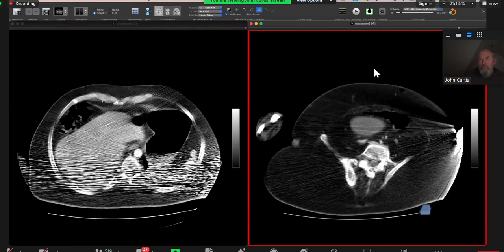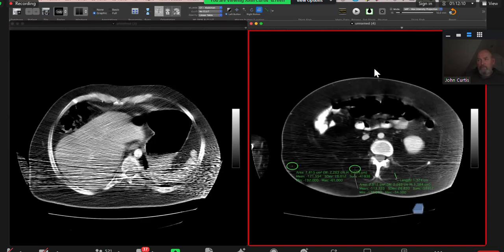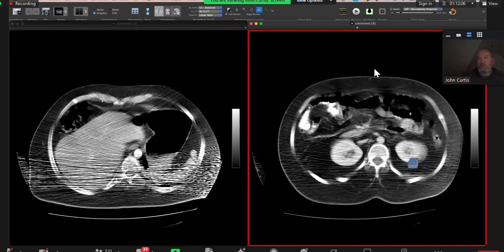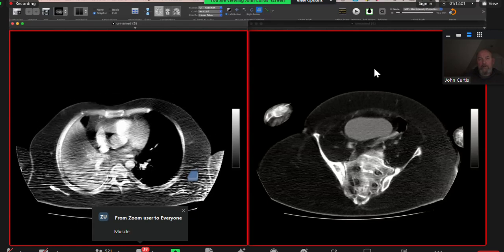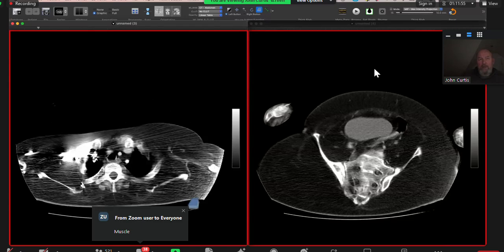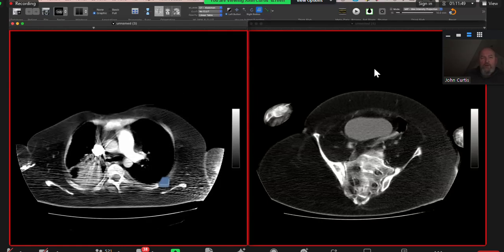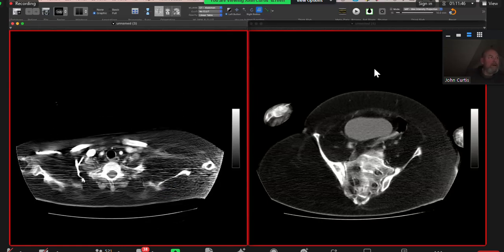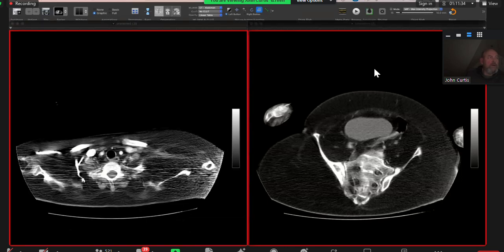Where are the gluteal muscles? They're absolutely absent. This is replaced with fat. Where are the pectoral muscles? They're also absent. Where are the scapular muscles? So all the muscles, it's essentially aplasia of the muscles, I guess. So what's the diagnosis? Poland syndrome? No. Does Poland syndrome affect the gluteal muscles? No, it doesn't. Maybe some form of muscular dystrophy. Yeah, which one?